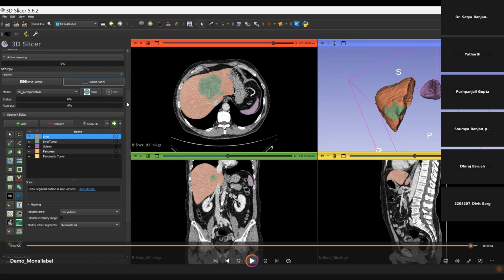Okay, then is there any image in your 3D Slicer? Can you see any image? Ma'am, I can see the normal image, not the color one, just the gray and black images, the CT scan. Okay, you can see the gray and black, but there is no annotation in your case. No, ma'am, no annotation, just the CT scan.